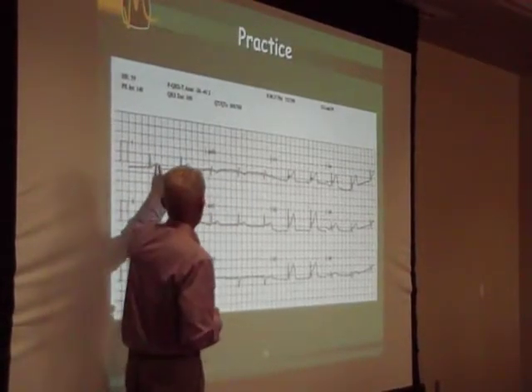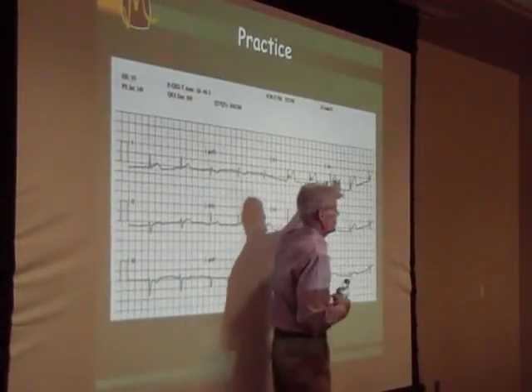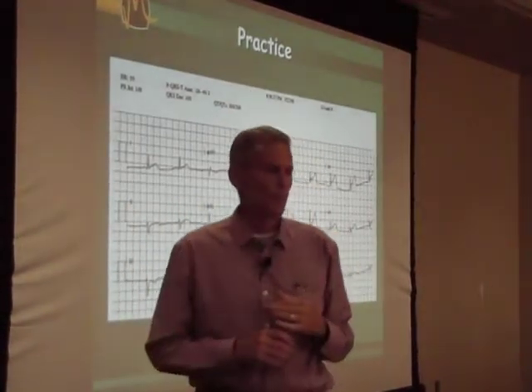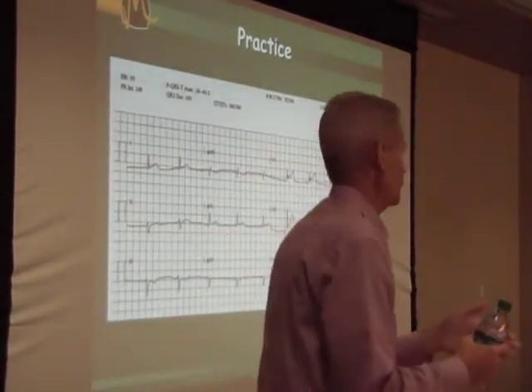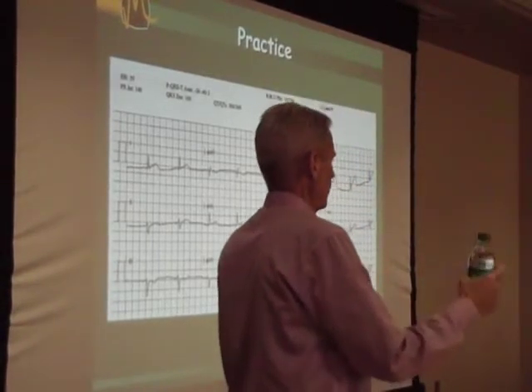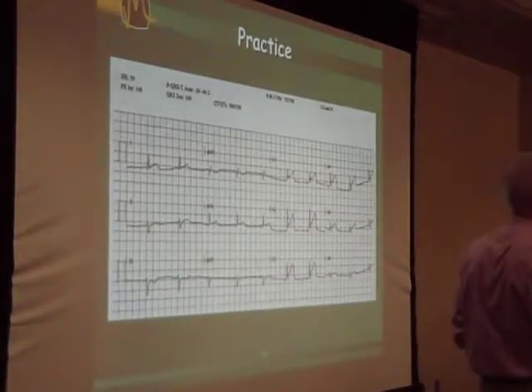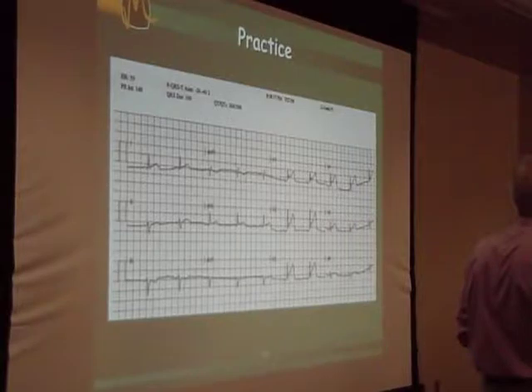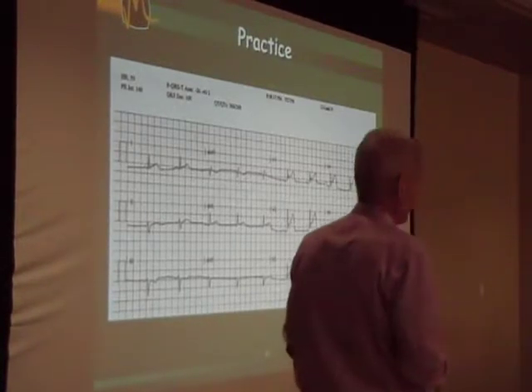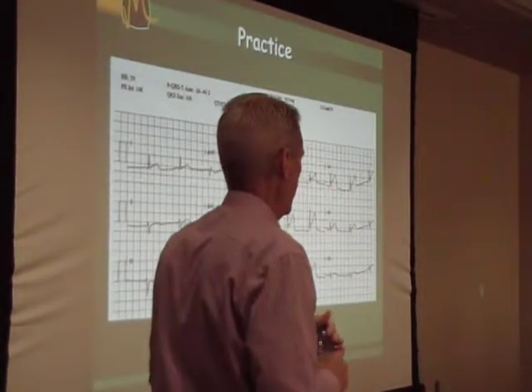Not as dramatic, but definitely you have septal involvement, anterior involvement, and lateral involvement. So we've got an anteroseptal injury with extension to the lateral wall, or the typical phrase they'll use in hospital is just an extensive anterior injury. So evidence of septal, anterior, and lateral views, we call that an extensive anterior wall MI.